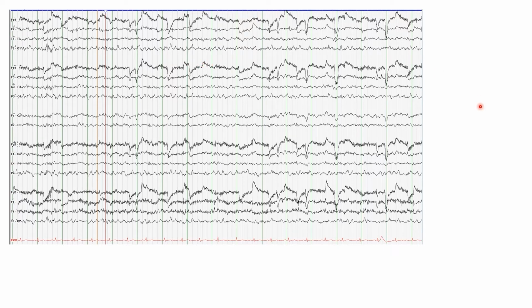Something we notice is that the patient is awake. We know this because there's a lot of muscle and there's a lot of eye movement, very frequent eye movement. And it's almost an erratic eye movement, including lots of short lateral eye movements. So the patient is doing something visually. Any ideas what this is? The triangular morphology and the fact that the patient is awake and having eye movement can possibly give this one away.